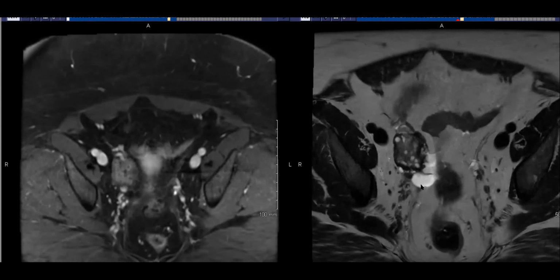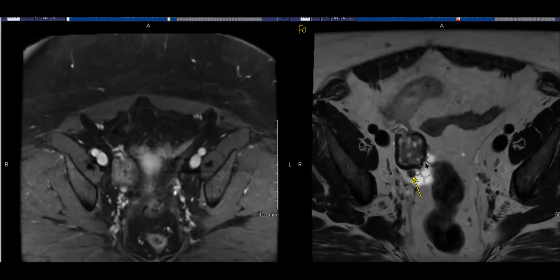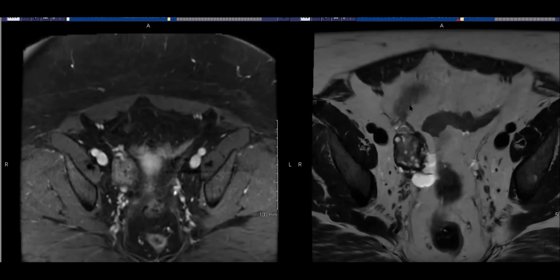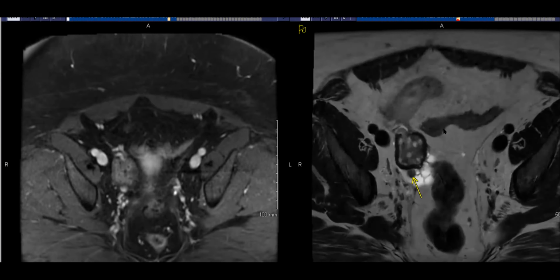The black garland is quite a befitting name, though. Yes, that's what it's called, the black garland sign. Pathologically, this is fibrous tissue? Yeah, it's ovarian fibromatosis. I would have searched for fibrous encapsulation of an ovary and seen what came up, but I wouldn't have suspected black garland sign.